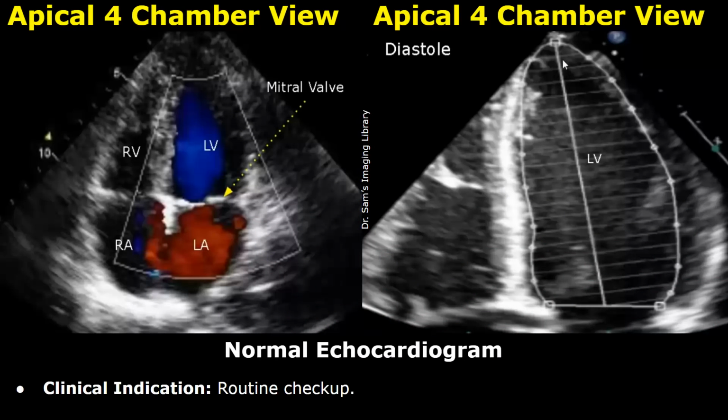You will learn how to write echocardiography reports for various cardiac pathologies. This will mainly include the findings and the conclusion. We will start with a normal echocardiogram. The clinical indication is a routine checkup.